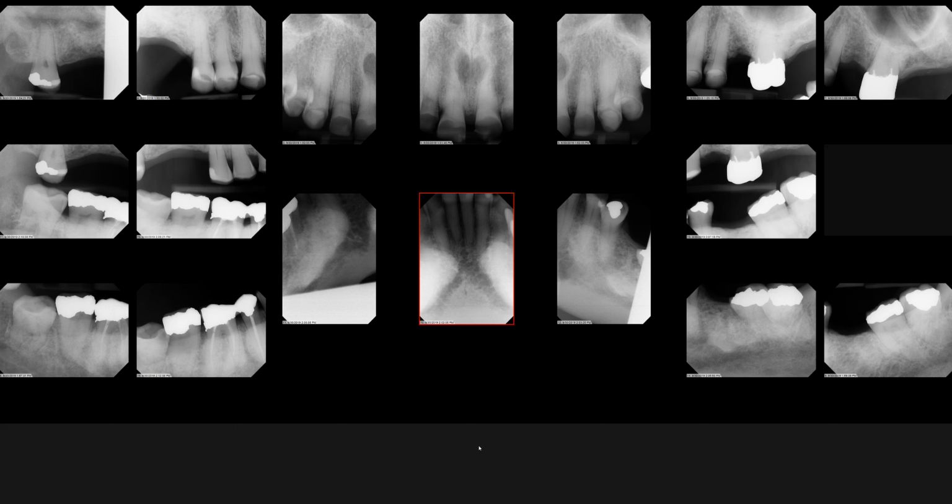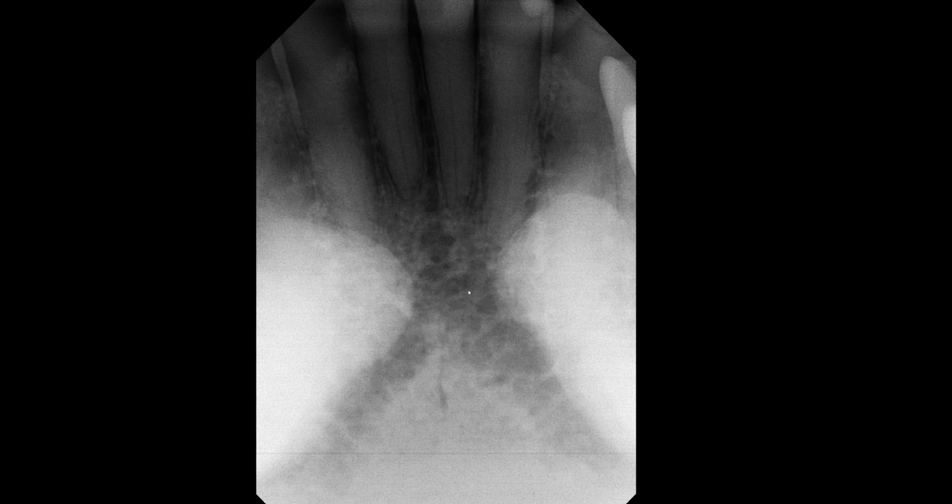This is Dr. Kim, and for this video I have another question for you, and that is with these radiopacities that we see bilaterally on this periapical radiograph. So let's take a closer look at these two opacities.